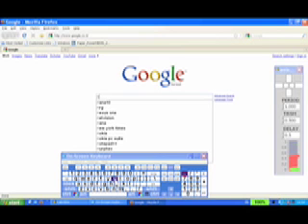Upward motion, stopped by a sniff. Rightward motion, stopped by a sniff. And letter O selected. Leftward motion, stopped by a sniff. Downward motion, stopped and selected. Upward motion selected, stopped. Side selected and stopped, and the letter E selected.